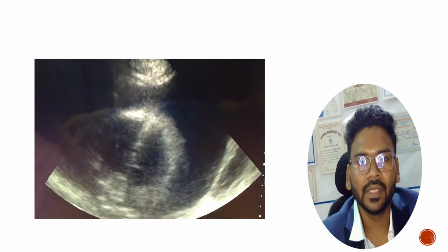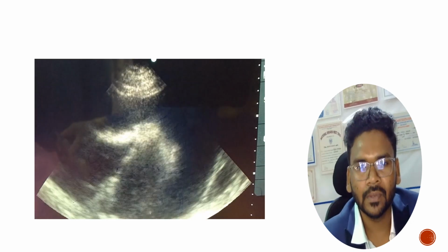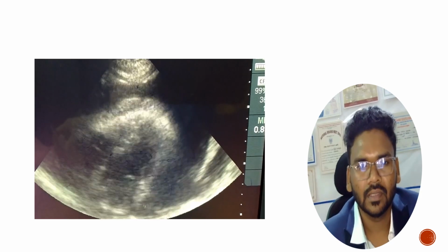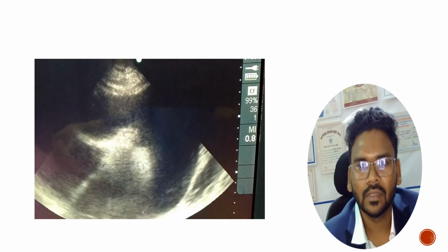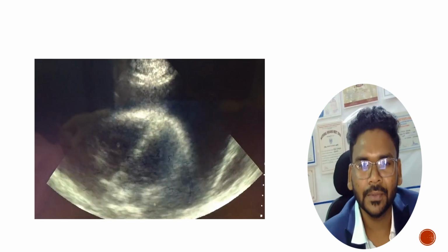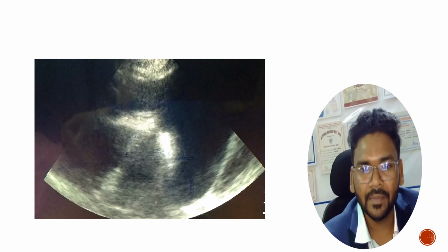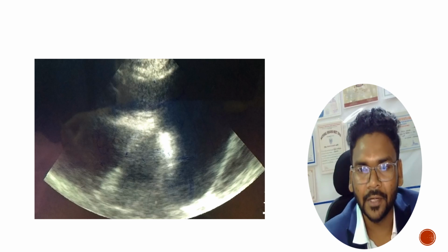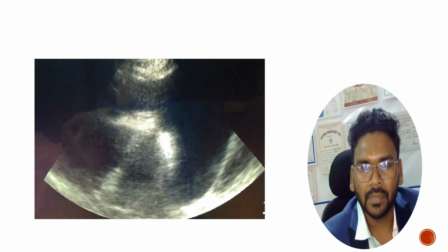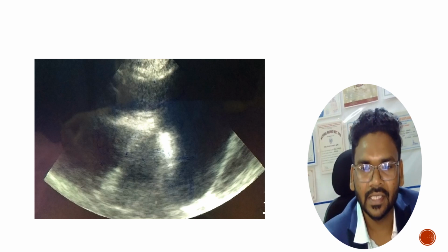Pericardial fluid most commonly appears as a black stripe around the heart. Fluid seen just in systole, a small effusion, is probably physiological, and fluid also seen in diastole is likely to be a pathological effusion, but still may be too small to cause symptoms. Heart rocking within a large effusion may mean the patient requires immediate pericardiocentesis. Right ventricular diastolic collapse plus distended IVC is suggestive of cardiac tamponade, and it is a clinical diagnosis.